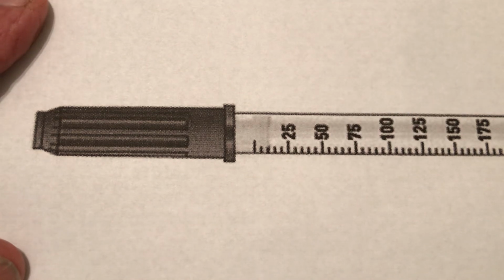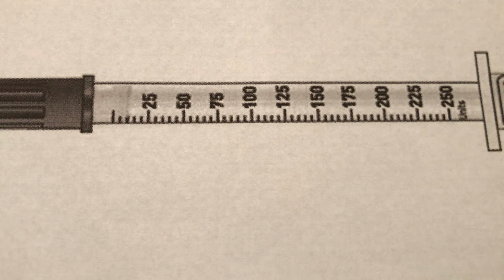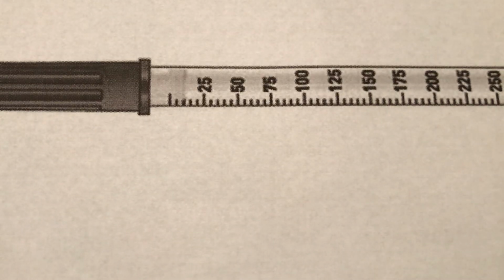So be very careful. The main thing is, let me say it once again, when you have to mark these syringes, of course, in the real world, you're actually pulling insulin into them. But in the course, you're just marking them. When you mark them, make sure you see, okay, each little mark represents what? In this case, each little mark represents an increase of 5. Some of those, it's an increase of 1. Some, it's an increase of 2. Look at each one separately and make sure you don't goof this up.